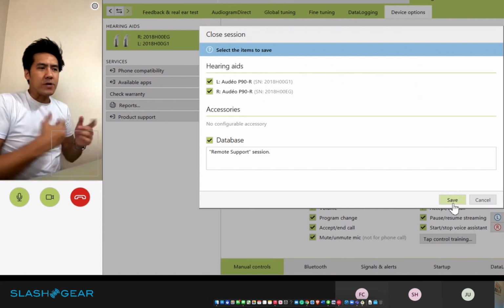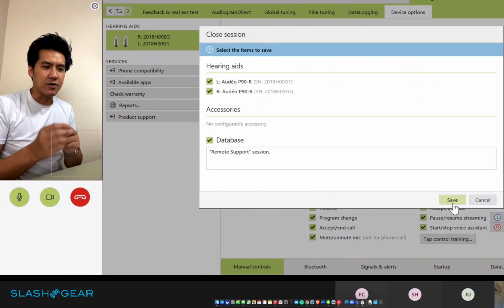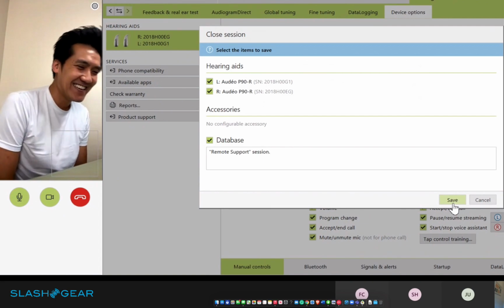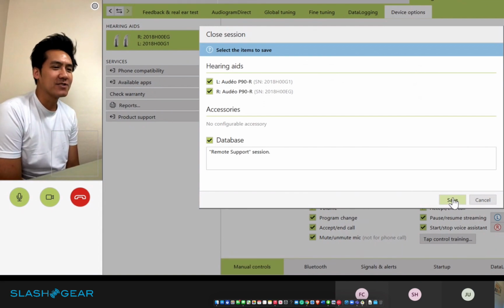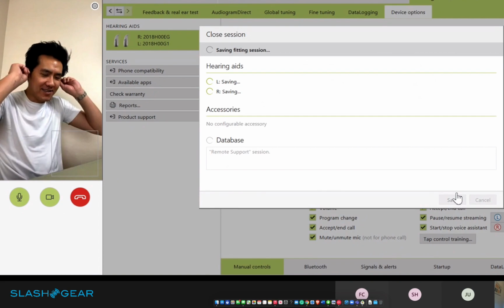Now, are we connected moving forward? Can I message you and say, hey, I'm experiencing this or that? Or is that just for a proper normal patient? So I'll go ahead and save, and then we can talk about hearing diary. Sure. Afterwards. Okay, so I'll go ahead and save this, and then that way we can let everybody else join back in as well.